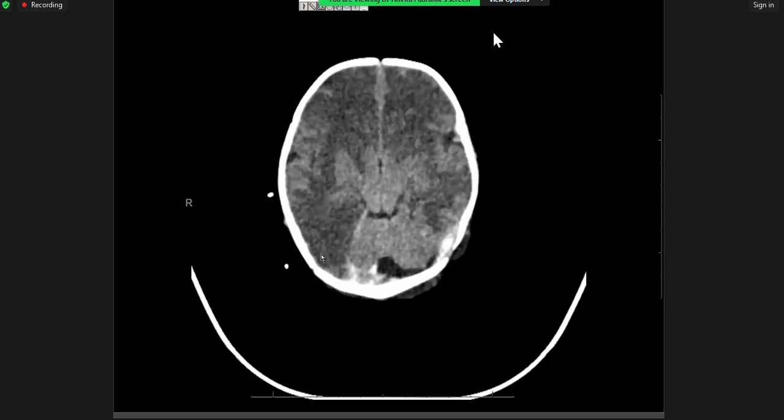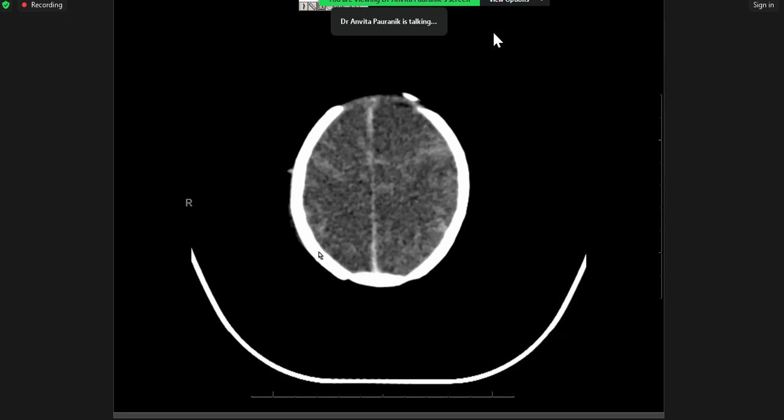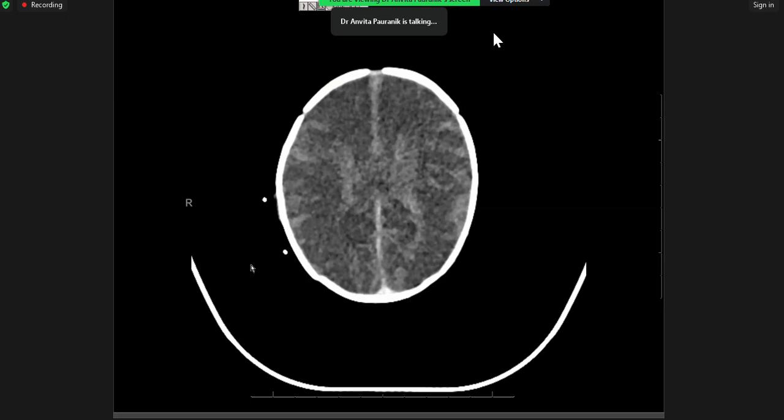Okay. Do you have any questions for this particular case? No, ma'am. All right. So we saw first a normal CT head of a 1 month old, and we saw one extreme example. The good thing is, on CT we are not usually asked to detect subtle or mild HIE. That is not the role of CT. The role of CT in this case was to figure out extensive damage, midline shifts, mass effects, hemorrhages, and big areas of edema. And this is what we are good at.